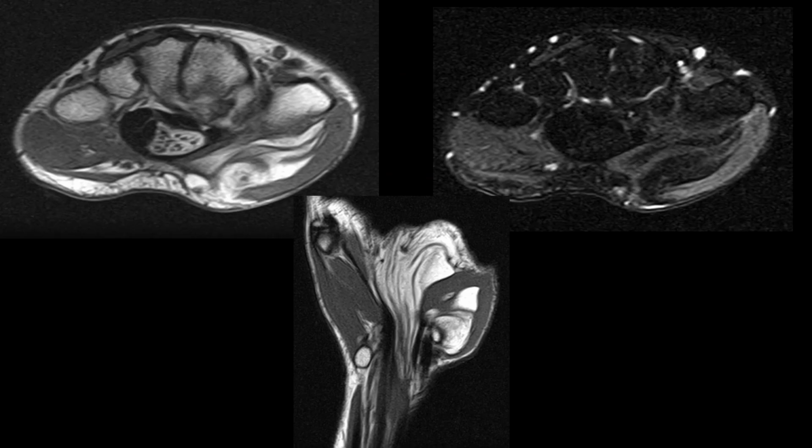Here we have a case that we don't see much in real life, but it is a frequent flyer on examinations because the imaging findings are pretty characteristic. So we have axial T1 and T2 fat sat images of the wrist and some coronal on T1. And this here is the carpal tunnel. Here in red will be the part of the carpal retinaculum. And in green, it's some of the flexor tendons that we see here.